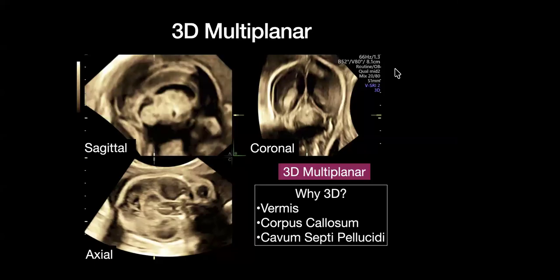I feel many people stray away from 3D, utilizing the 3D applications or types of advanced imaging, because it takes too much time. Well, how are you supposed to learn? You have to give the time. So even if it means scanning a patient every day, saving the volumes, and when you have time, manipulating those volumes, it could really help you to be proficient. Because when you encounter that abnormality, this is where it's going to be helpful, right?